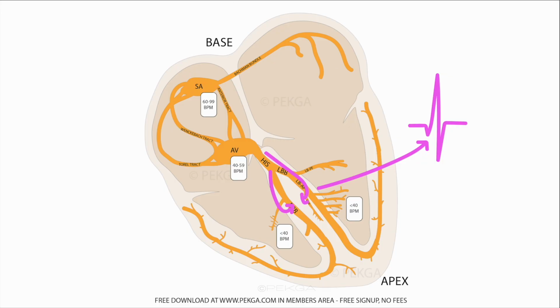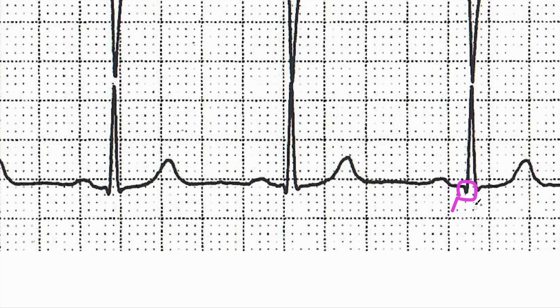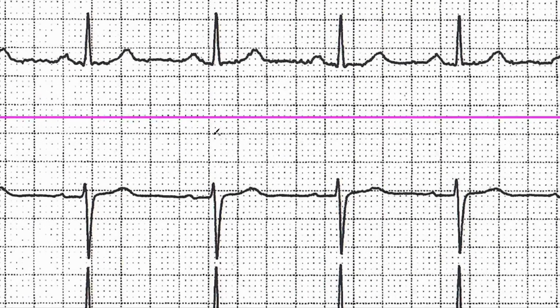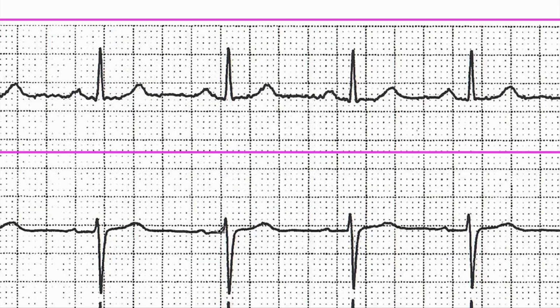Okay, and I think that what we're seeing here is just a little bit of that septal depolarization. Nothing interesting. I am going to remember this though. Now, one thing that I do like to do here, and this is probably a great example of this: when it comes to the QRS, I like to find the widest beat possible, and I like to measure it out. I'll show you something interesting here.